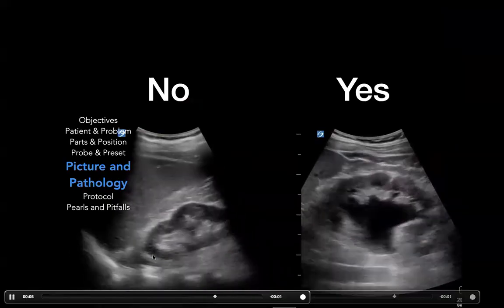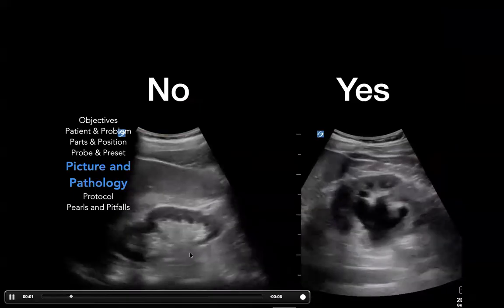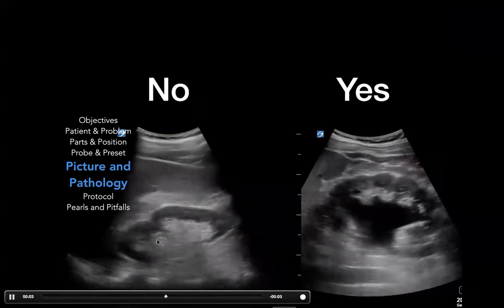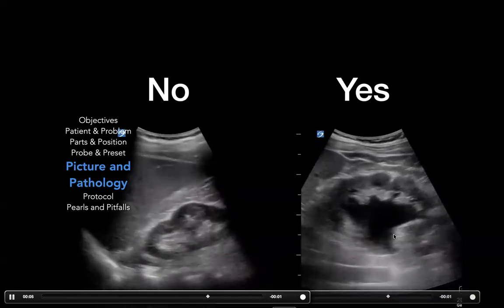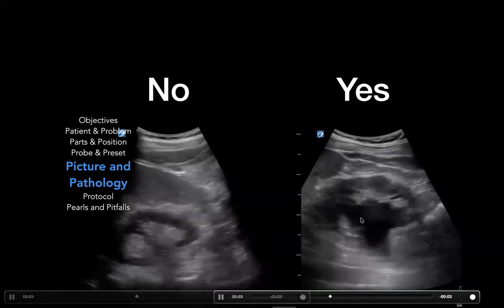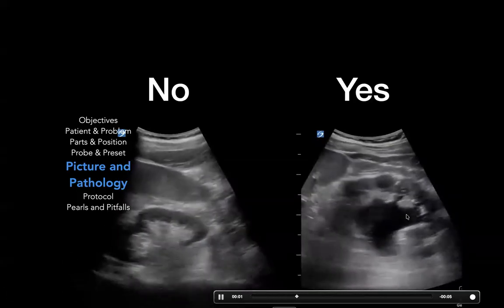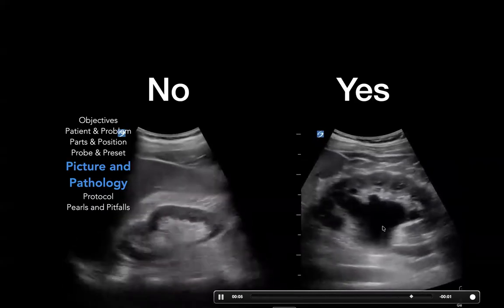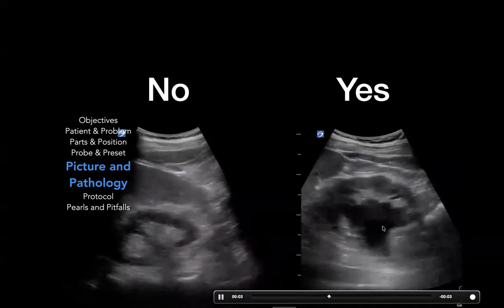On the left-hand side, this is your normal kidney, as we just talked about. We have the hyperechoic renal pelvis in the middle here, and then the renal cortex surrounding, versus the image to the right, where you can see the blown calyces and this bear claw-like appearance with the black color all in the middle here. These are the blown calyces indicative of moderate to severe hydronephrosis.